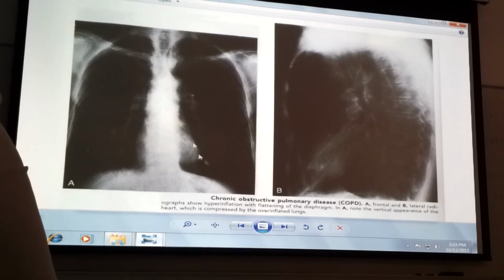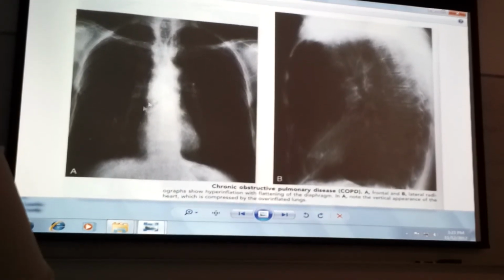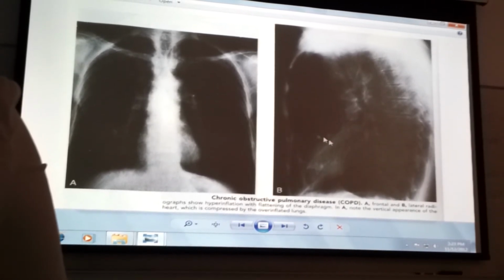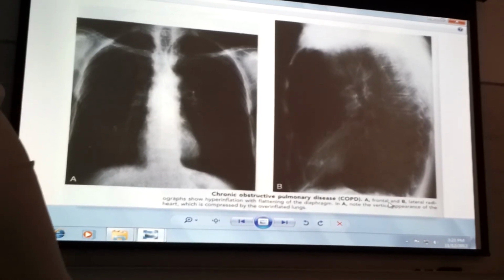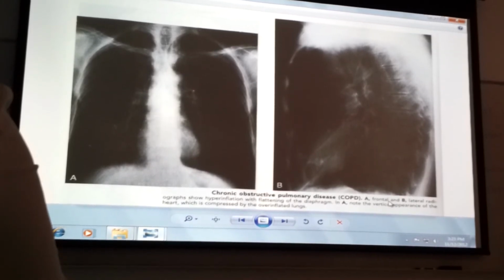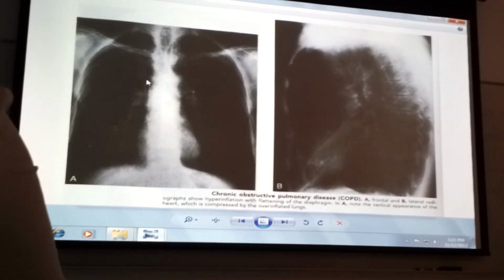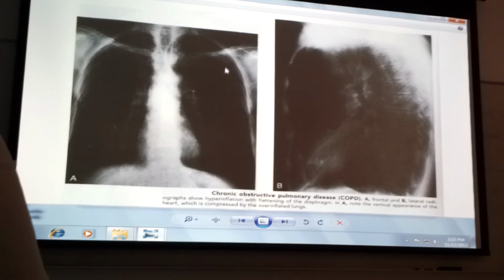Emphysematous changes, hyperlucency, widening of the AP diameter, barrel chested, right? Increased markings, small heart. There are about 5 different things that, when you see a COPD or an emphysematous chest, you'll just know it. After you see a lot of them, you'll know that it's an emphysematous chest by history and everything. Patients have trouble breathing, can't walk 2 steps. The lungs are so black, it's almost as black as outside the film. You'll see a lot of this, okay?